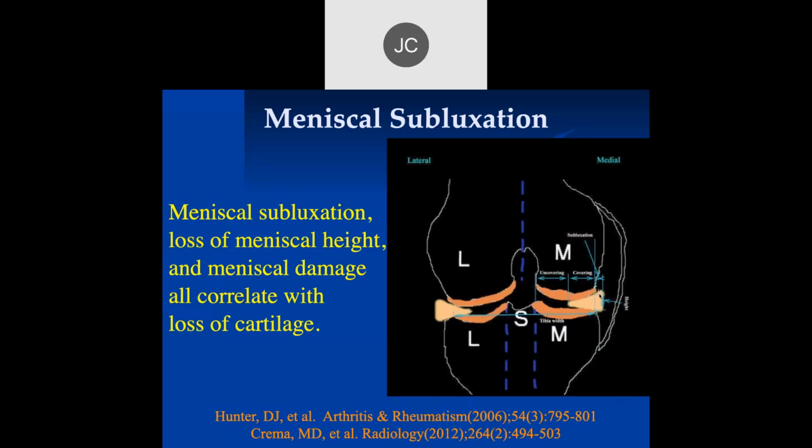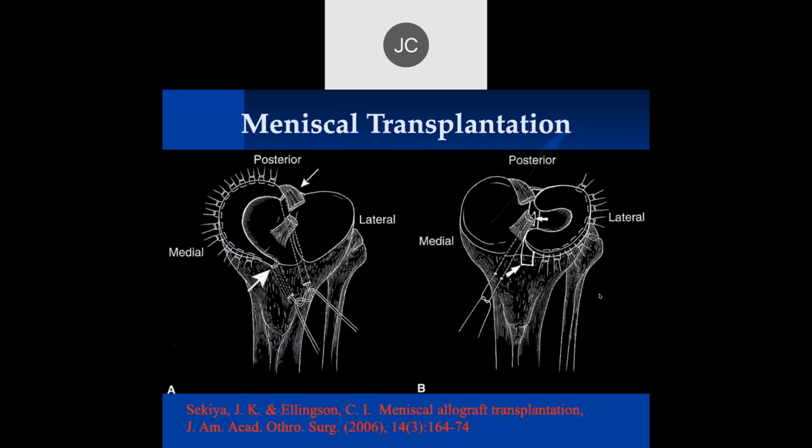We also like to look in the sagittal plane right after placement, because we'll talk about placement in a minute, and sometimes placing it properly can be a little bit difficult. Now, there are a lot of different techniques for doing meniscal transplantation. On the medial side, there's a technique where you can do tunnels. In fact, often with this particular technique, people like to get a graft where the bone is still attached here, because bone heals very well to bone, but soft tissue doesn't.